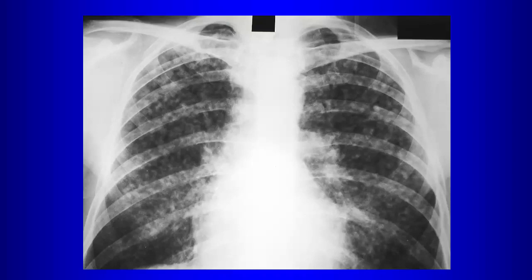So if you have a lower lung distribution of nodules or a miliary pattern or micronodular pattern on chest radiograph, there you think what? Mets, because the mode of spread is hematogenous, right? So hematogenous spread favors the lower lungs. So there you would favor hematogenous dissemination. What's the distribution here? Upper.